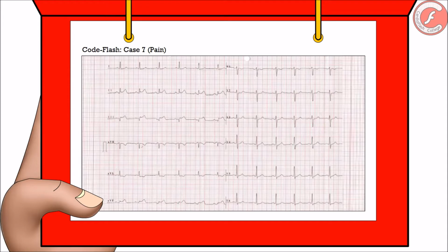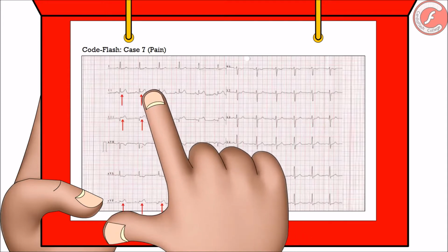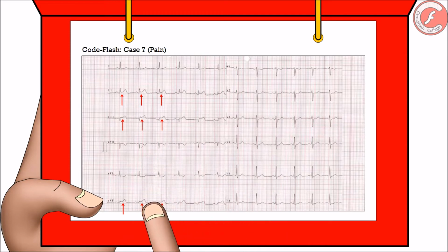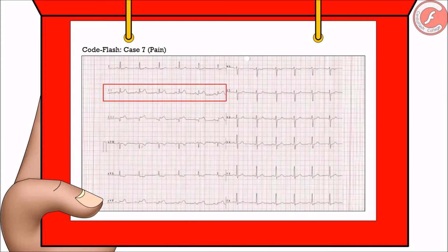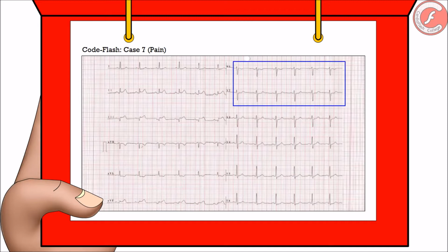That's it! In this electrocardiogram, we have an elevation of the ST segment on inferior leads 2, 3, and aVF. It is relevant to point out that the elevation of the ST on 3 is higher than on 2, and there are no changes of the ST segment on right precordial leads. This is why we can expect the right coronary artery to be responsible for this infarct, not the circumflex. In any way, it is evident that the patient has an inferior STEMI.